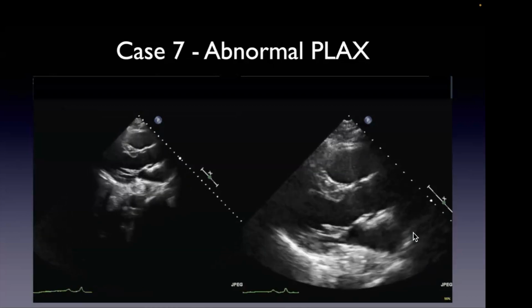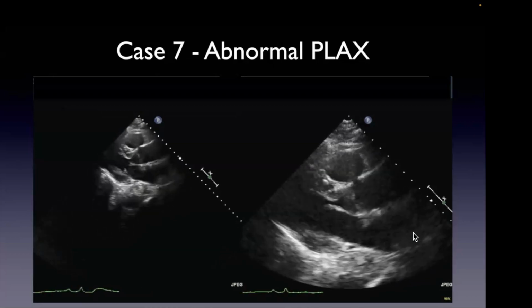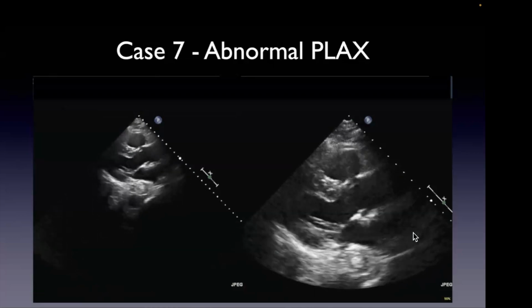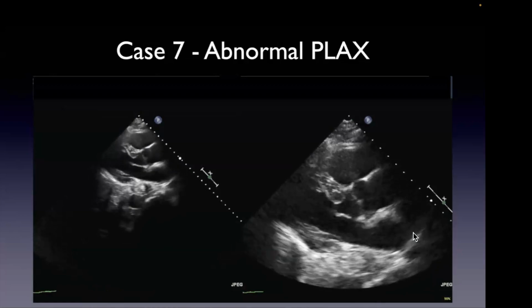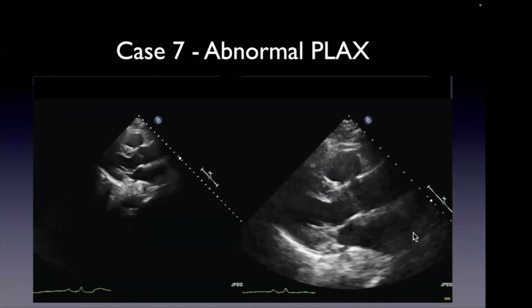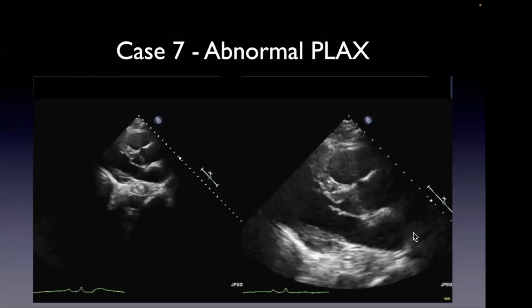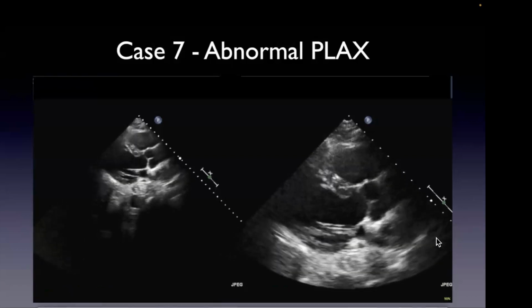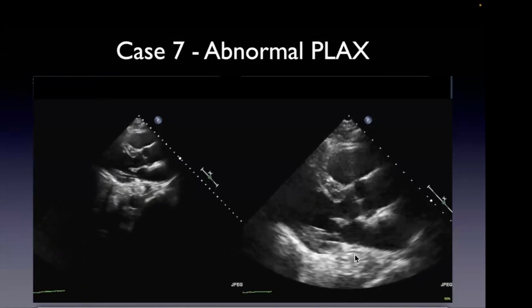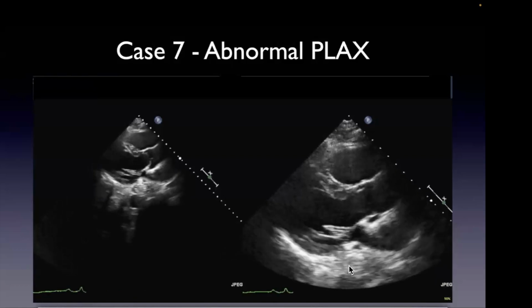What about this? What the heck is that? Kind of same location. It's like a device in the descending thoracic aorta. Yeah, so it's some kind of device for sure. It looks foreign. And actually, why do you say it's a stent?